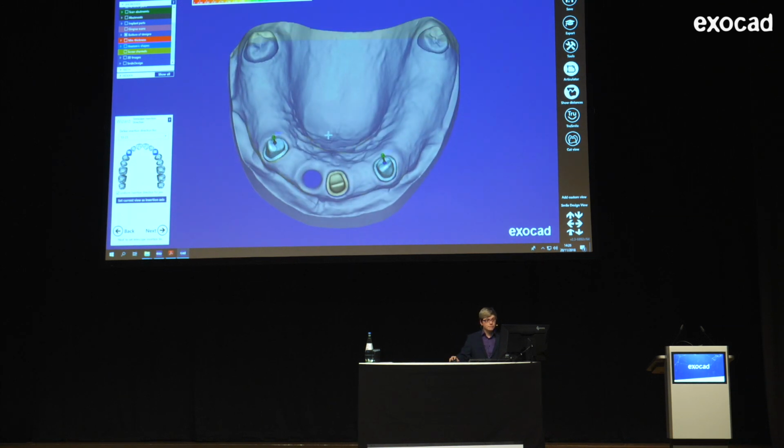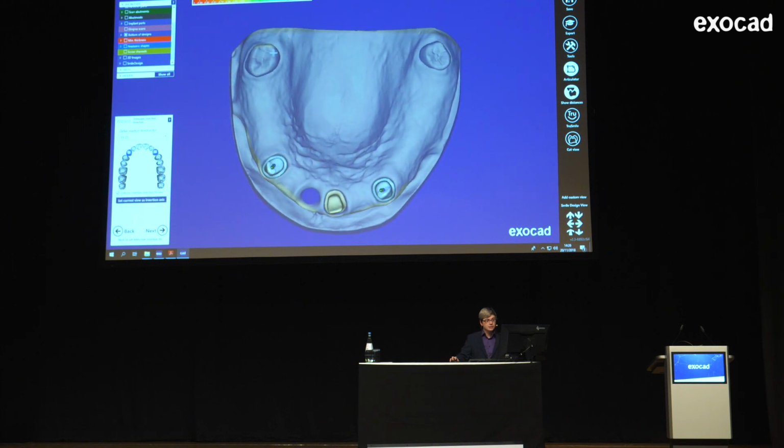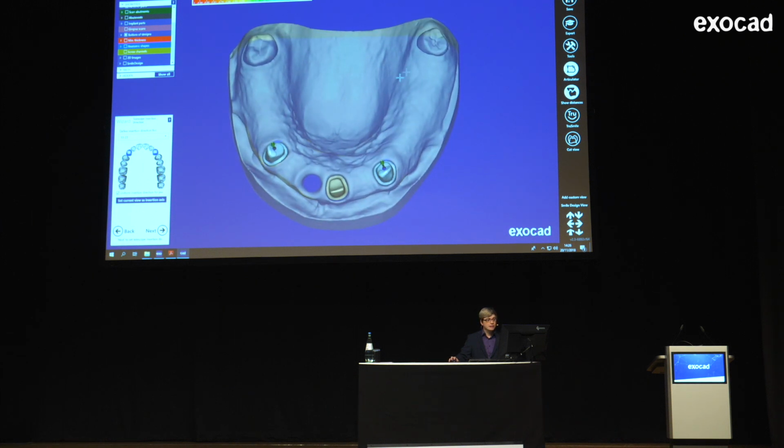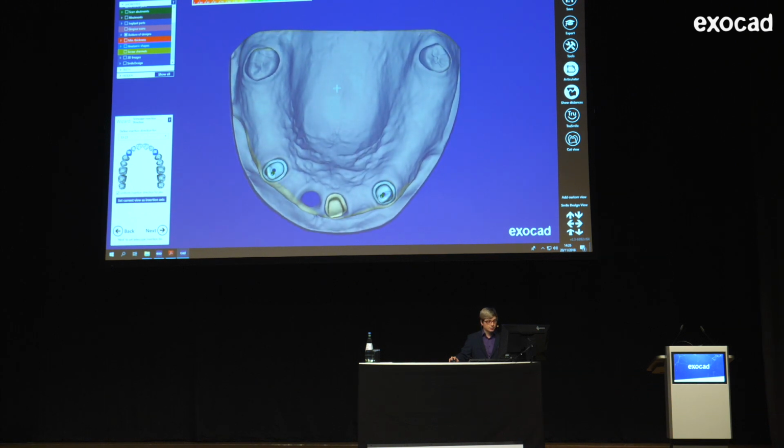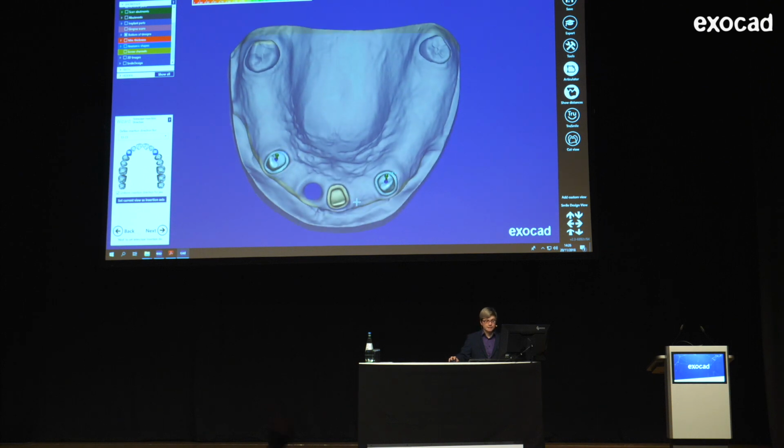And here, if I'm making the model a bit transparent, I can actually see undercuts here, because at the end, I'm going to place clasps here. But you also see, I can't really get undercuts on these teeth without tilting the model completely, and this is not a good insertion direction. So I'm choosing something like this, where at least here I have some. And they're also a bit in unison with the dies themselves.